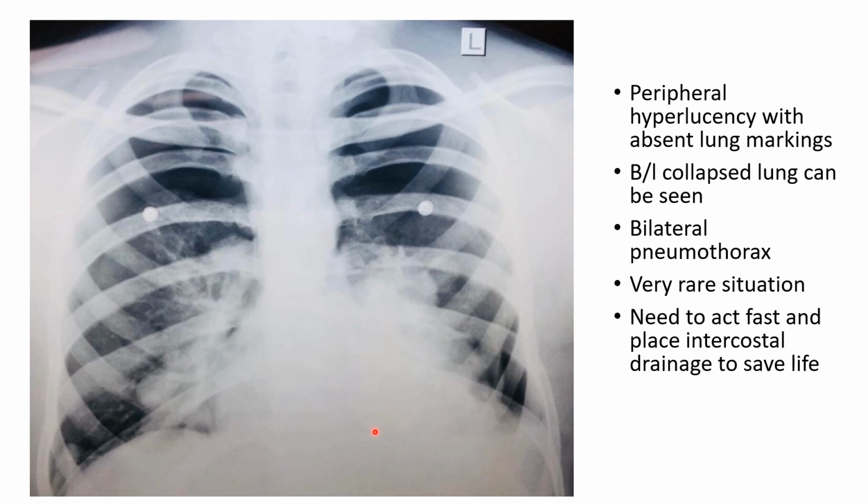This X-ray is quite dangerous because here you are having a bilateral pneumothorax. Bilateral pneumothorax are quite dangerous because unless you intervene as soon as possible, the patient can die of asphyxia.